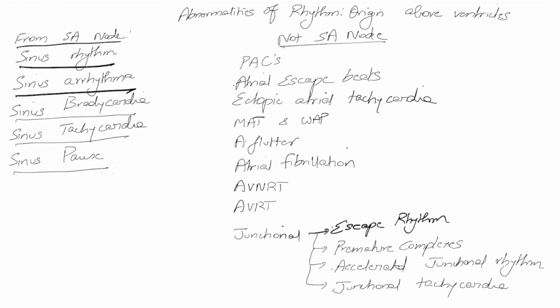And lastly, in sinus pauses, you see a flat line with no P waves because the SA node suddenly stopped working. In elderly people who are not on heart rate slowing agents, when you see a sinus pause, especially alternating with periods of bradycardia and tachycardia, consider the diagnosis of sick sinus syndrome, which may potentially need an intervention.